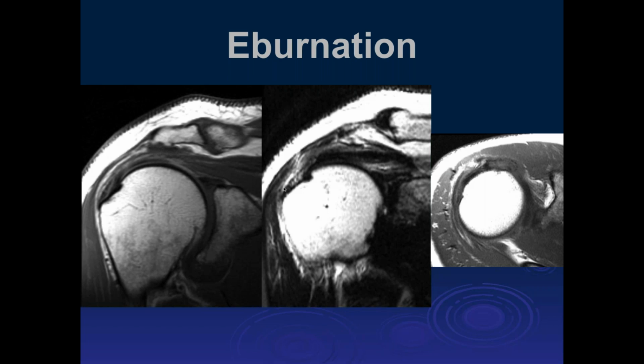that can produce increased signal intensity along the bursal side surface of the supraspinatus tendon, which can lead to tendinosis and then to partial tears and eventually a full thickness tear. And we can see the increased signal on the axial T1s here.